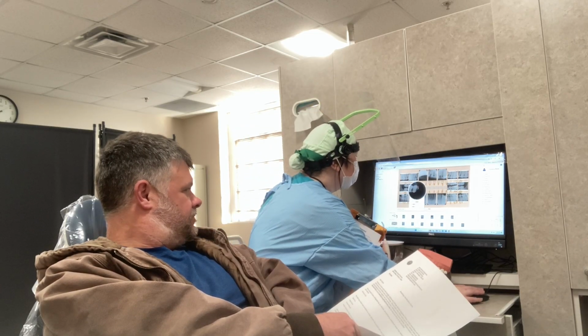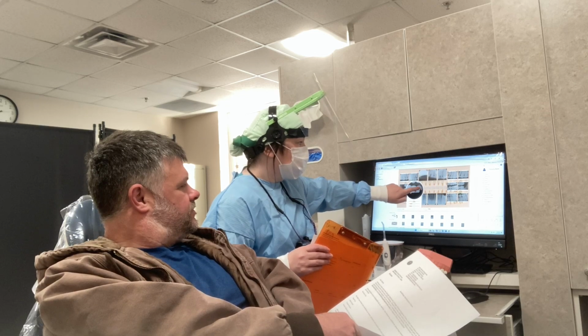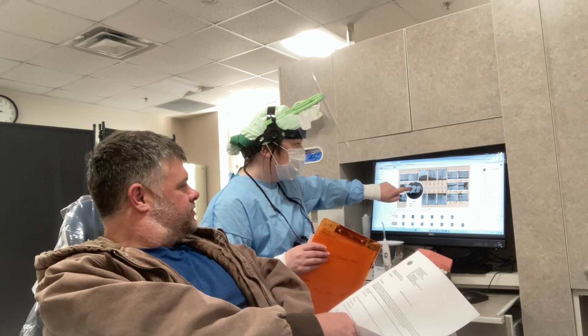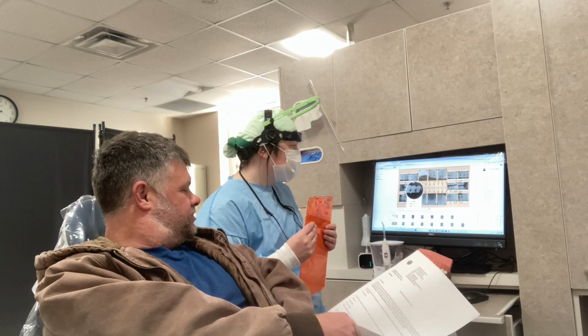So whenever it comes down here to that composite, it's not like this is the typical and how it kind of just follows the curvatures of the tooth. Whereas your composite, whoop, it zoops out like that. So that's kind of a neat thing too. So we see a composite there.